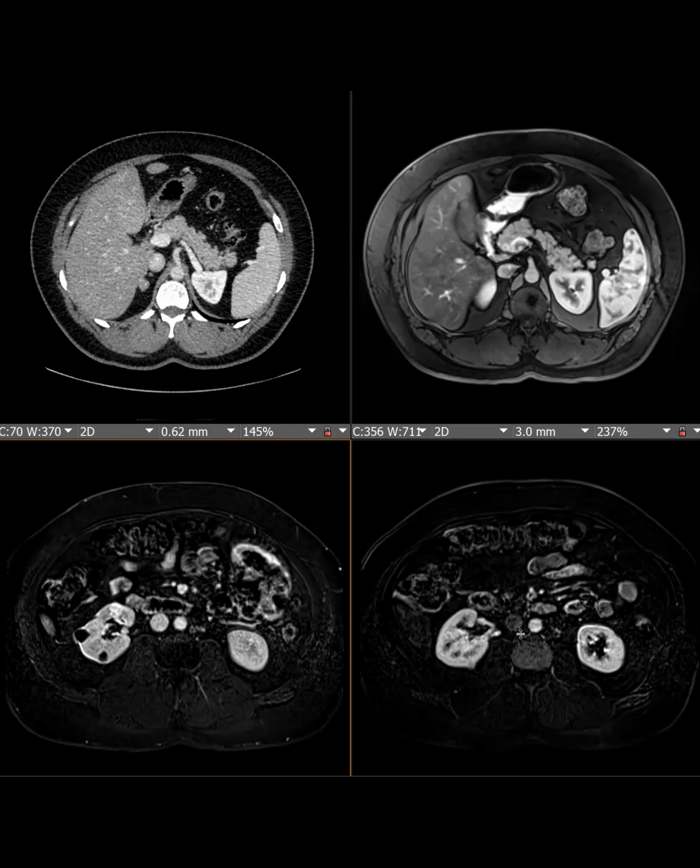But this was an interesting case with a bunch of the findings, so I wanted to just show it really quickly. Wait, quick question. For adrenal gland, they get pheos, right? Yes, pheochromocytomas, correct. And they were resected and they were pathologically proven pheochromocytomas both on the left and on the right. Yes. He's actually currently being followed up for these RCCs in his kidney.